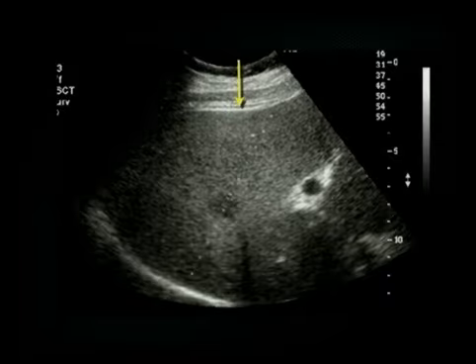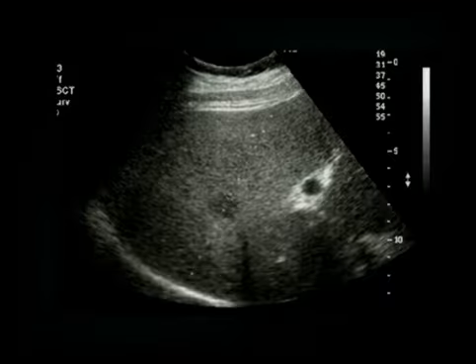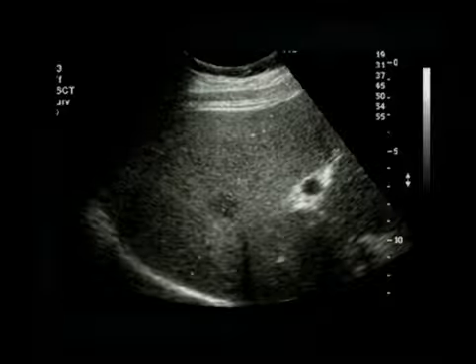When ultrasound interacts with these small reflectors, the sound is scattered in all directions, a small amount of which may return to the transducer to produce the image. Diffuse reflectors produce the characteristic echo pattern associated with the parenchyma of organs such as the liver and spleen, kidneys, and uterus.